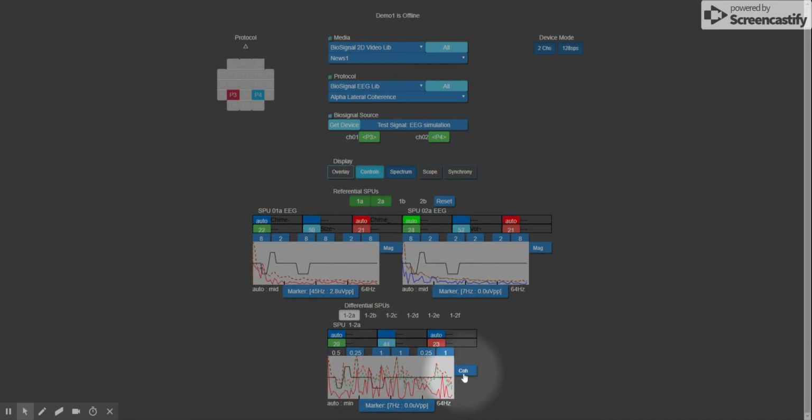In fact, there are many functions. Co-spectrum, quad spectrum, phase, synchrony, synchrony co-spectrum, synchrony quad spectrum, power differential, the power difference between frequencies in channel 1 and channel 2. So that's why it's going above and below zero. The summation of the powers in channel 1 and channel 2. All of those functions, and the complex differential, the complex subtraction of the powers in channel 1 and channel 2, and the complex addition. So there's about 10 different functions that are applied to the FFT.